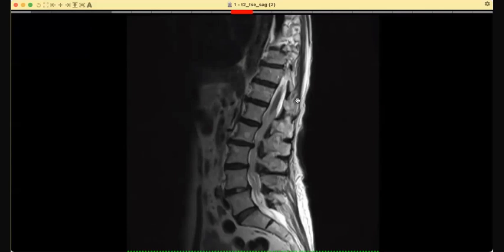77-year-old female, lower limb weakness, lower limb loss of sensation, bladder and bowel dysfunction. Over to you. You will ask for the mouse, or should I scroll for you? Oh, okay, I will ask for the mouse. Request remote control. The mouse is with you.